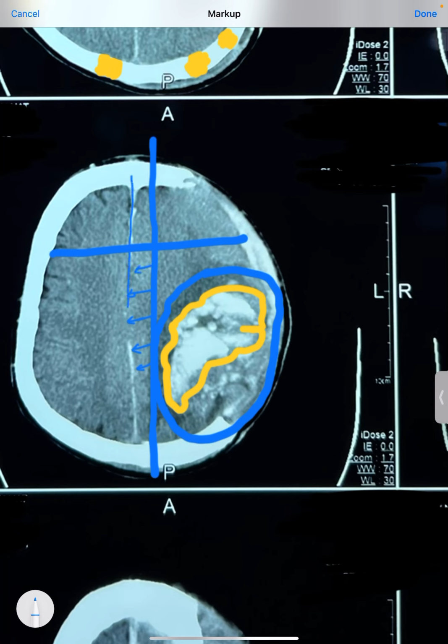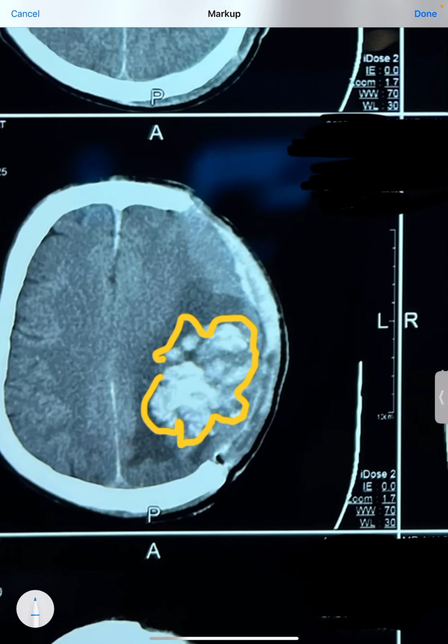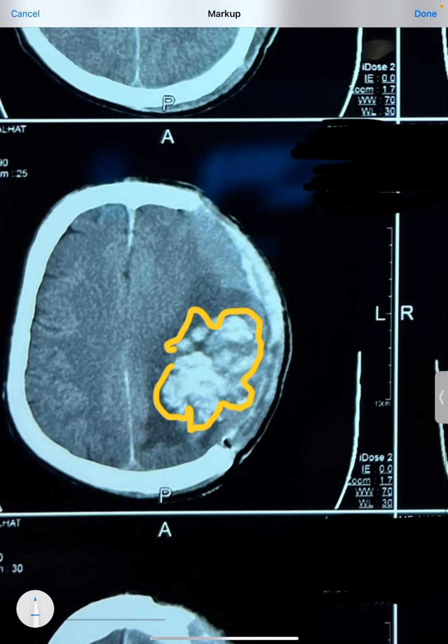So this midline is completely shifted to the right side, and the shift of the brain can be very clearly noticed. See this diameter and see this diameter. This much is much lesser than this. This is far away from this. So this is the midline. This is the sagittal vein basically, and there is more of a bulge.